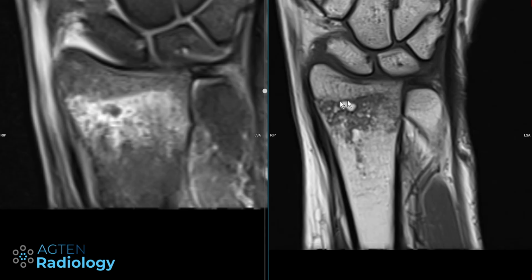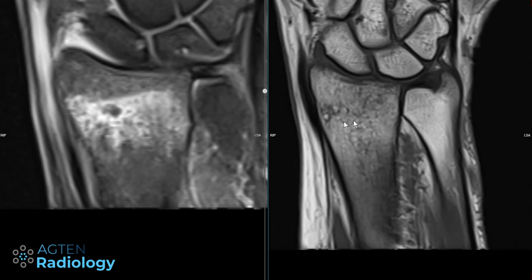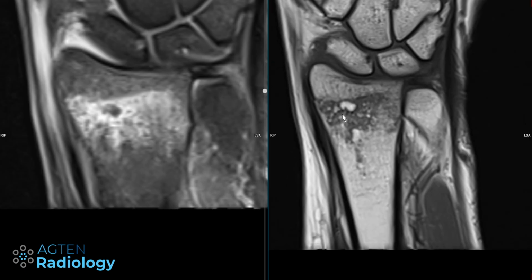We can also see this sometimes with bone bruising or fractures, with the bone releasing fat globules, due to necrosis of marrow fat cells or whatever the pathophysiology is. If you see something like this, it is suggestive of a fracture, or fat globules released due to the trauma. We know that fat can also be released inside the joint. We all know the FBI sign in the knee, etc. But this is just a nice example of something like that.